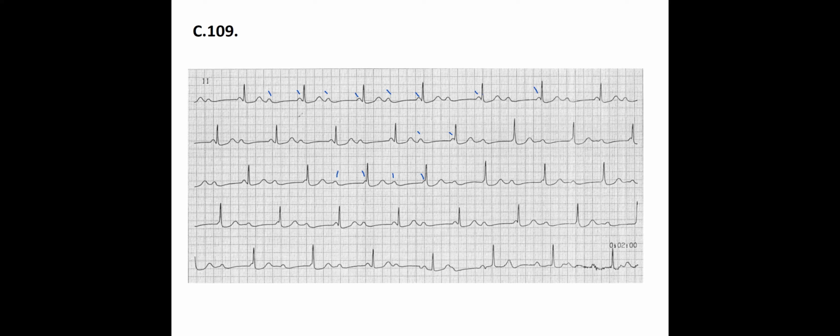And if you do see this kind of feeling that the PR is getting shorter, for sure it's a third degree. There is no way that you can have the PR getting shorter unless you do have a third degree.